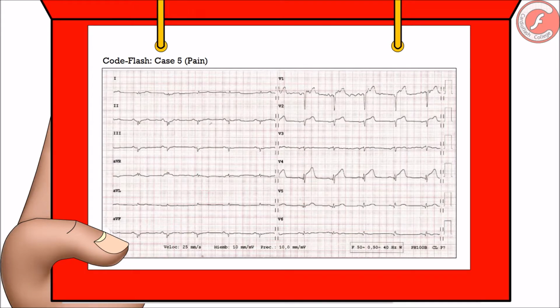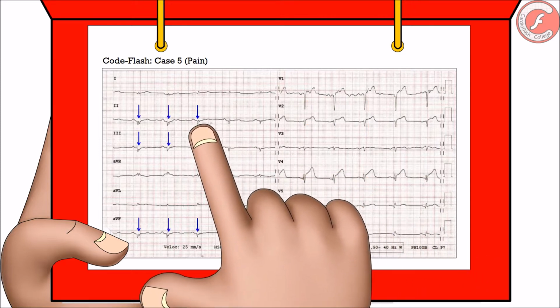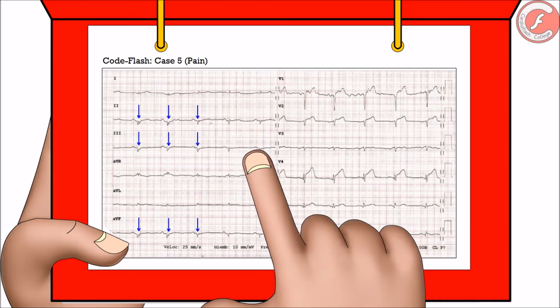That's it. In this electrocardiogram, we have the next alterations. First, elevation of the ST segment from V1 to V4. It is curious that regarding the rest of anterior leads, V3 presents an ST segment practically normal, probably due to an anomalous localization of the electrode. Second, Q waves on inferior leads. These are 2, 3, and aVF, which suggests an old infarct on this location.